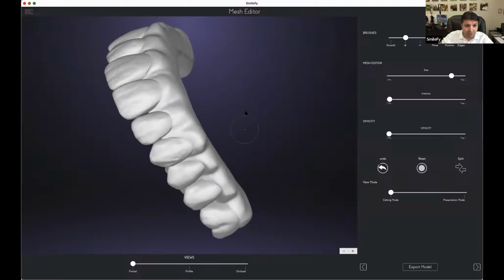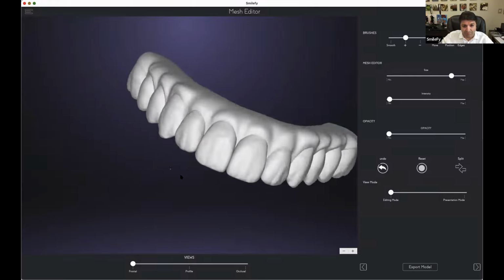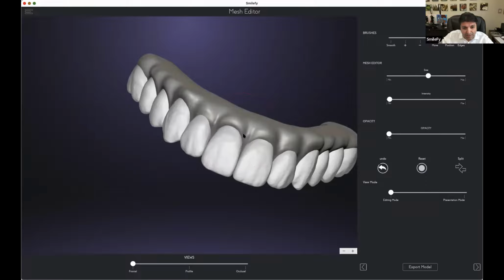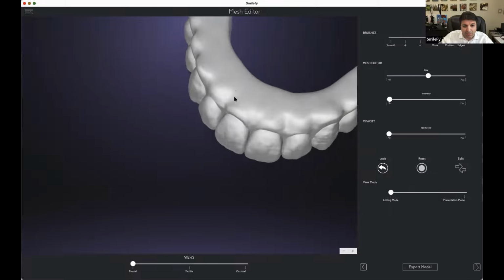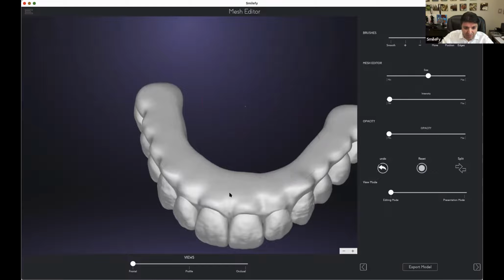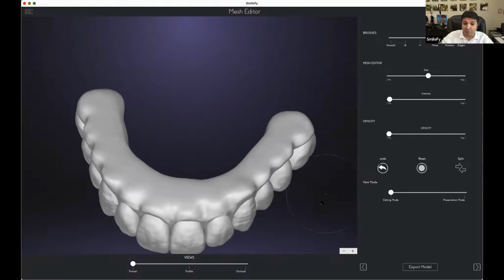That looks okay. Size, move. I'm going to readjust the centrals a little bit. We can go from different perspectives, and in different perspectives I can cover my gums in a different way. Of course, that's something that I don't have right now in this prototype.